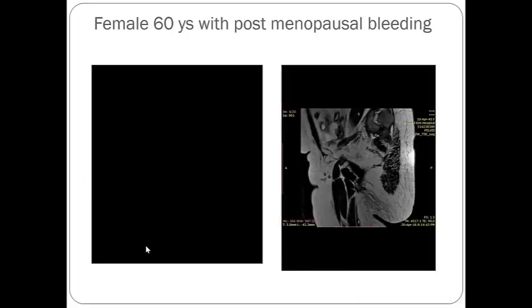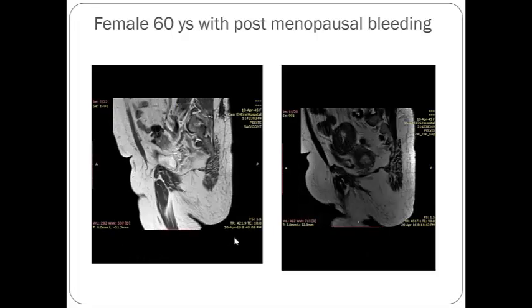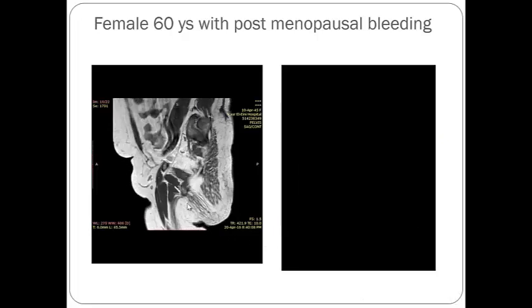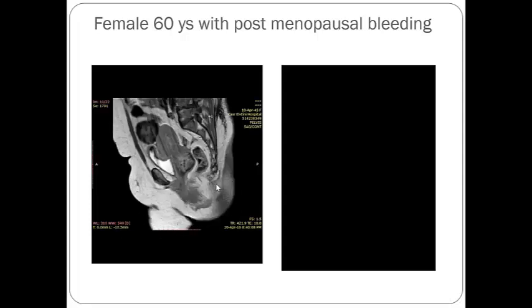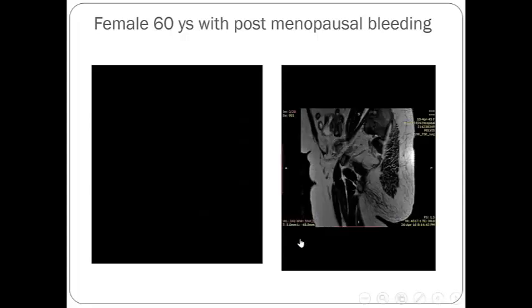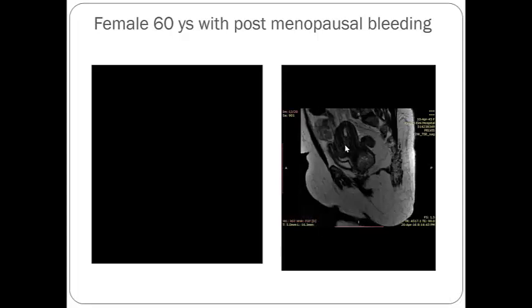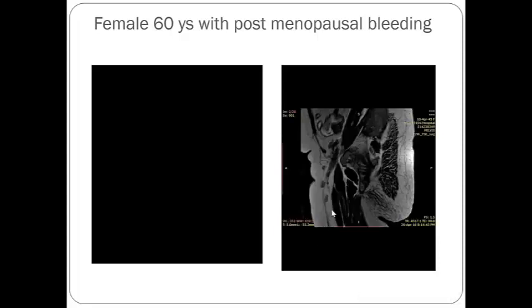Of course, in this case, the first possibility you will all say is that it may be a malignant lesion. And I think one of the colleagues reported that it may be cervical carcinoma. No, it's not. I have another lecture on the intracavitary uterine lesions, and this is one of them. It is only distending the cervical canal, but it is not arising from it. Here on T2, it is arising, the broccoli sign. In the intracavitary lesions, this is the broccoli sign.